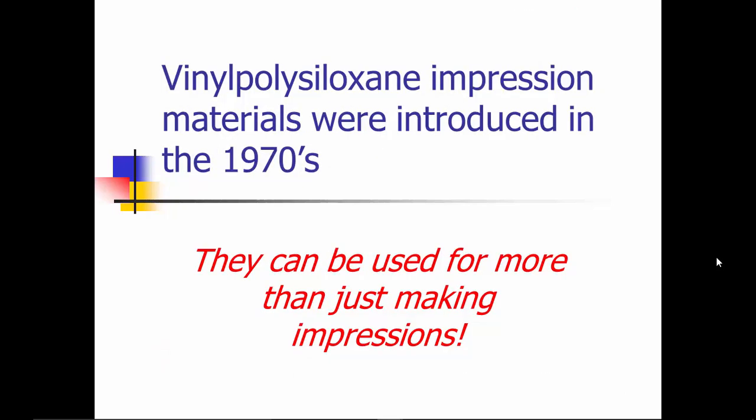First of all, vinyl polysiloxane impression materials were introduced in the 1970s. But they can be used for more than just making impressions. Let's take a look.